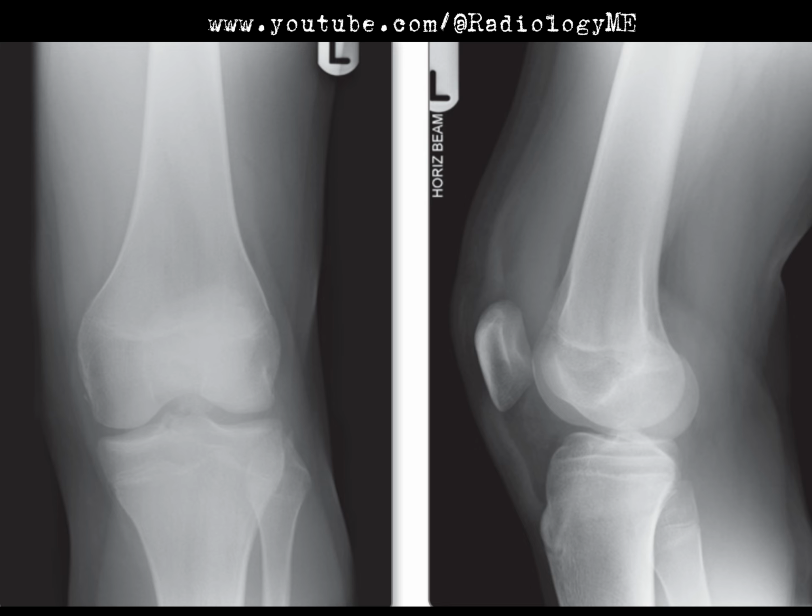But before we get too ahead of ourselves, we should also think about the next steps, right? What do we need to do next? Well, I'd recommend an urgent MRI because, as we said earlier, we need to get a better look at the soft tissues, ligaments, menisci, all of that good stuff. The radiographs can only take us so far when it comes to soft tissue. If there's any doubt about the bony structures, we might even want to throw in a CT scan just to get a more detailed look at the fractures.